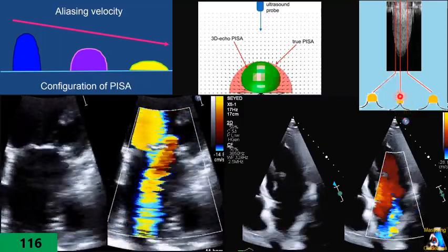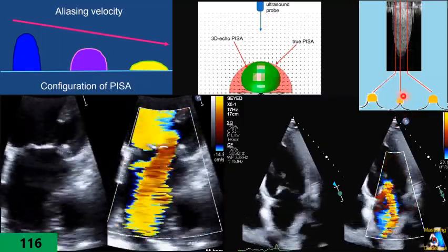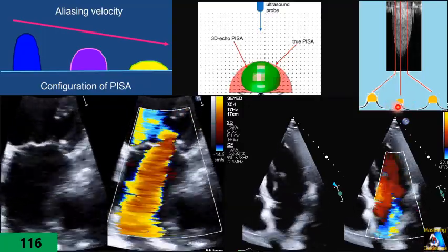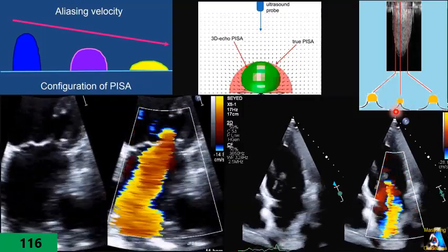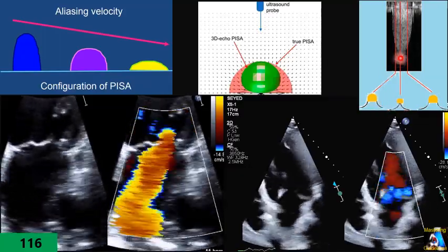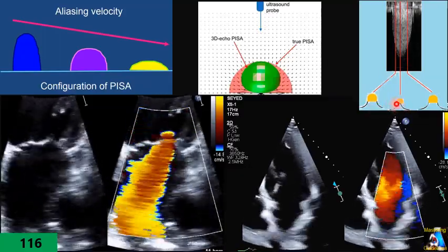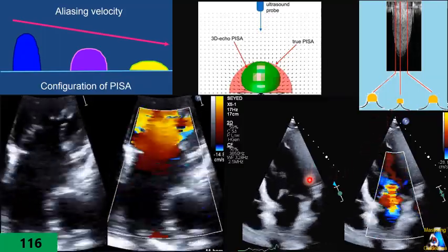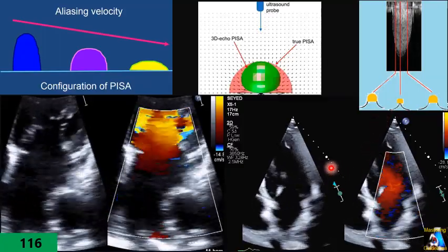It showed that if we measure at mid-systole, it will be underestimated. The best technique for solving this problem is to measure at both early and late systole and take the average of them, or we use M-mode PISA, which is still under research.